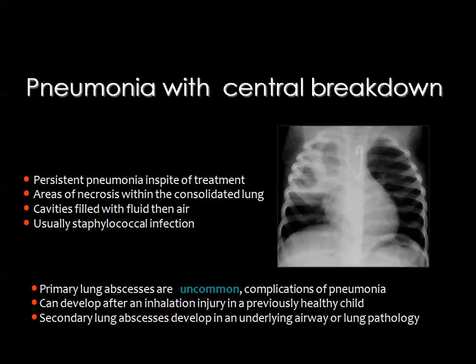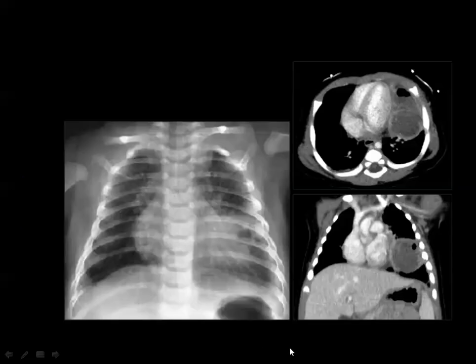This may result from persistence of the infection and poor response to medical treatment, resulting in the development of cavities within the area of pneumonic consolidation, and this is commonly seen in cases of staphylococcal pneumonia. Of course, you see here a foreign body which has been aspirated, and it may obstruct the trachea or bronchus, resulting in this unresolving inflammatory process.